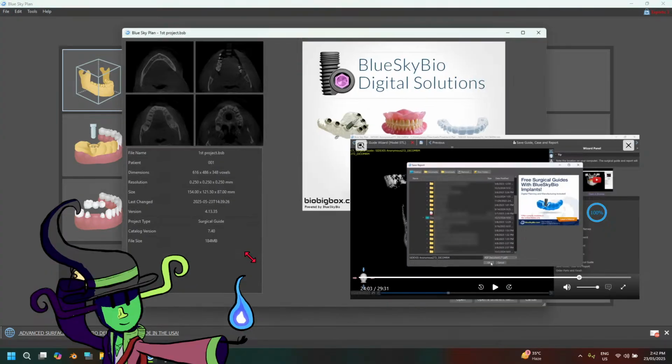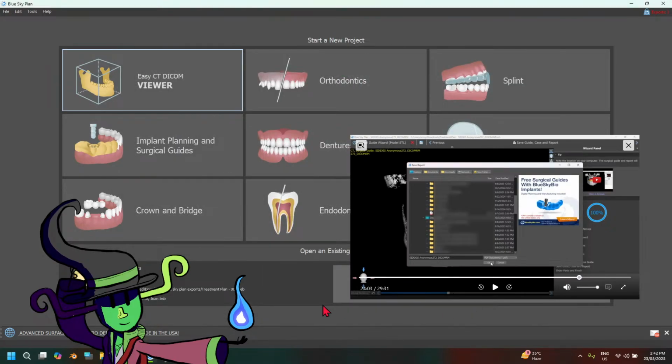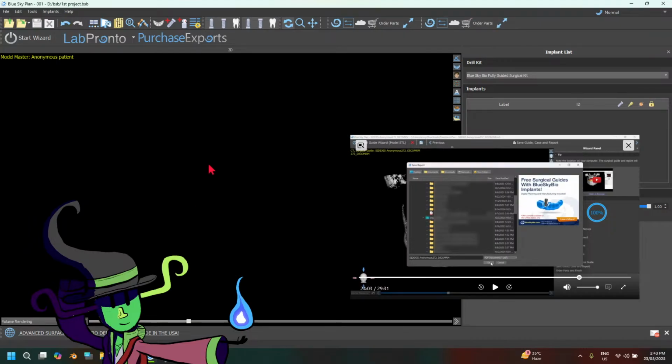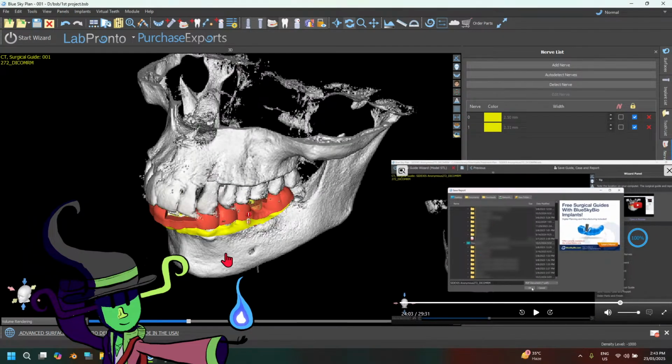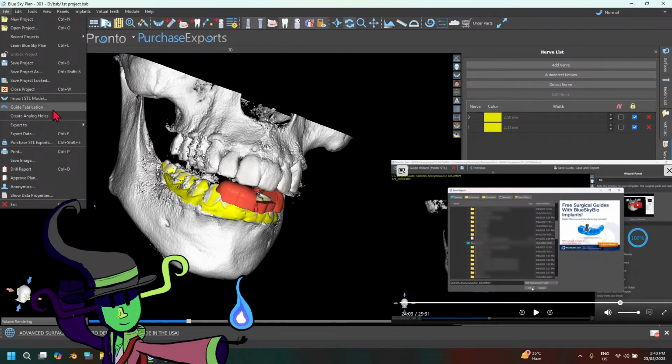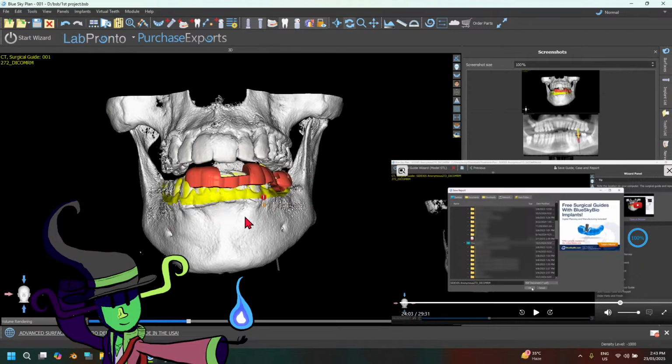Let me see. All right, let me open up this one. Open. Okay, there it is. Now, can I save a report here? Does that cost money? No, I think I still need to export the file before I can create a report of this. Oh, here we go. Drill report?